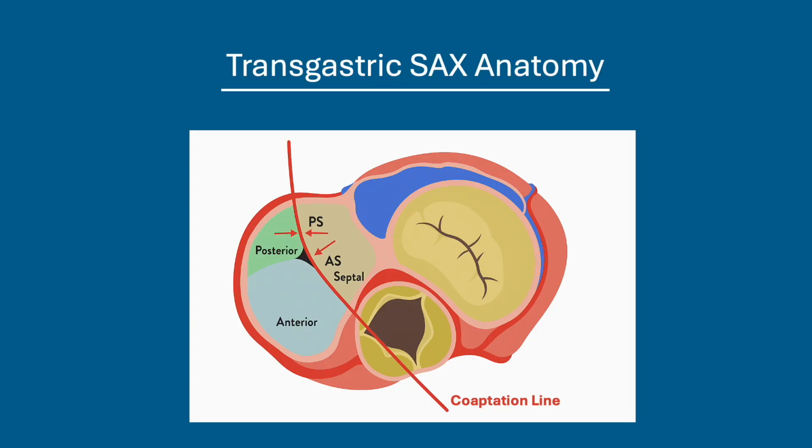It is common as an intra-procedural echocardiographer to watch the operators place clips between the anterior and septal leaflets, as well as between the posterior and septal leaflets along the coaptation plane.